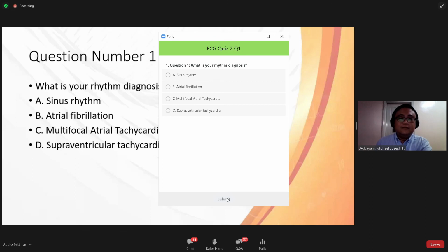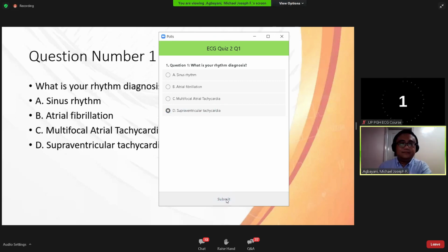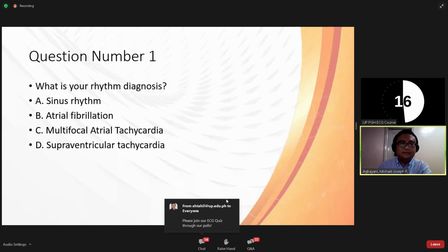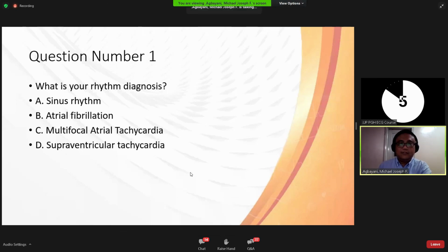Or D, supraventricular tachycardia? Few more seconds.